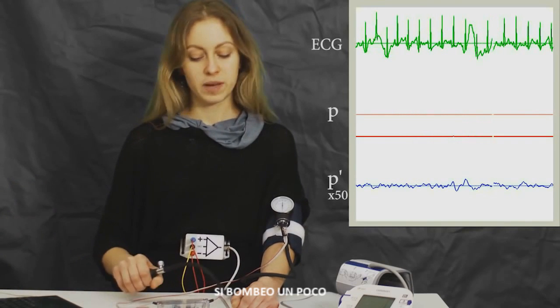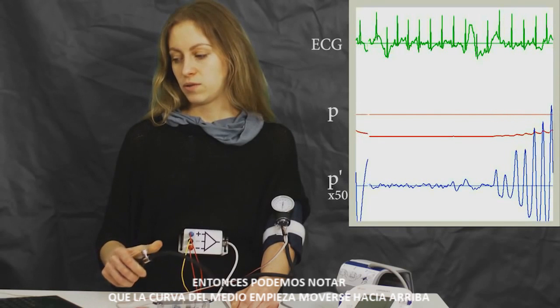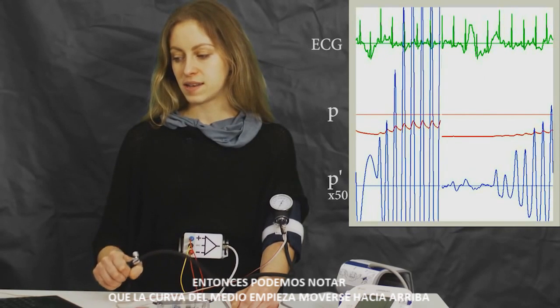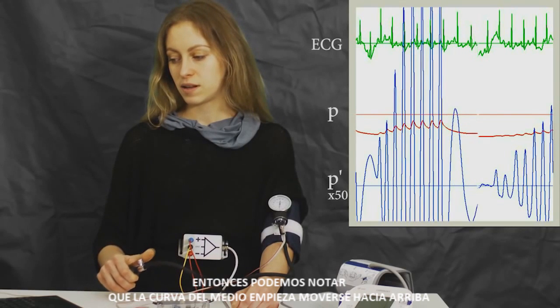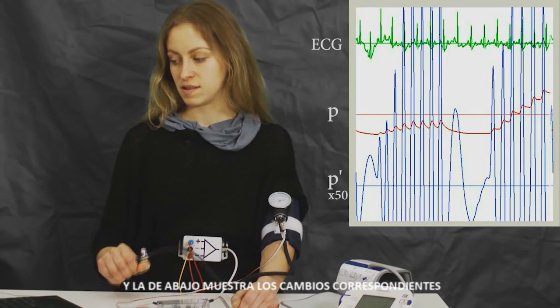Now, if I pump my cuff up a bit, then we notice that the middle trace is starting to move upward, and the lower one is showing the corresponding changes to this movement.